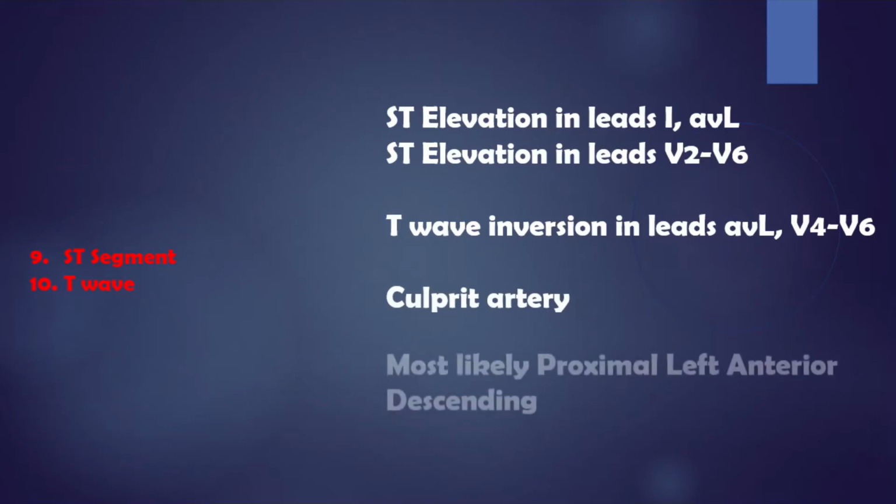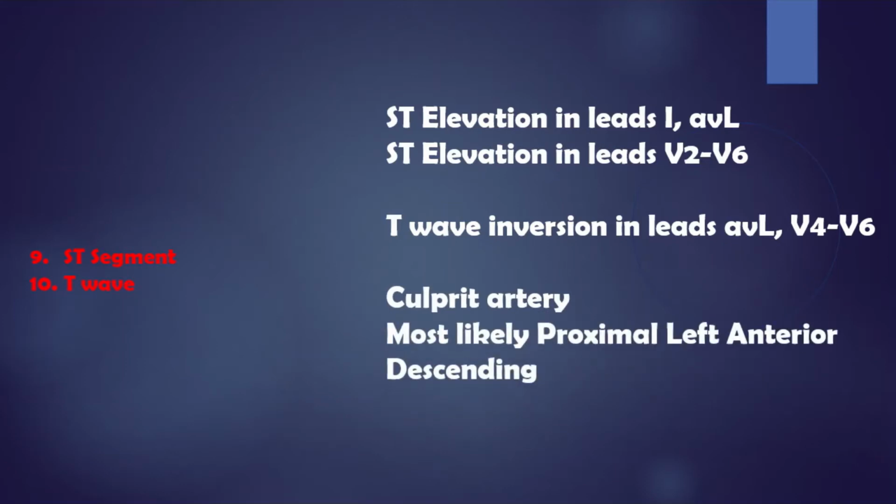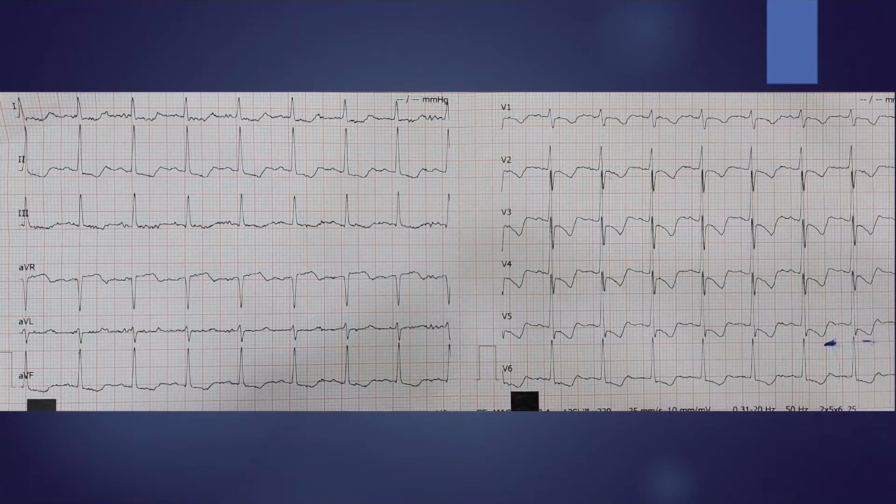Most likely the proximal left anterior descending. This was a STEMI. What do you think of this ECG?